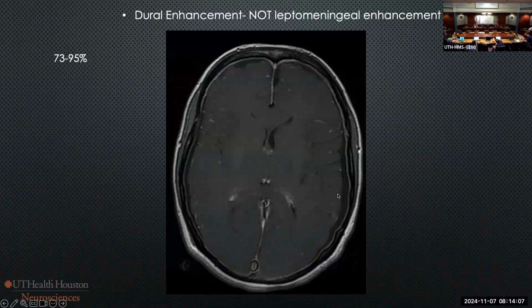Very, very important. Why? Because of the venous engorgement. Because we believe that dural veins? Yes. Dural veins. We believe of the dural veins, yes. In the dura. Yes. So the dura would actually thicken like an edematous dura? Correct. And then you can see in this patient, it's not quite so obvious, but do you see there's a small subdural effusion as well? It's interesting.